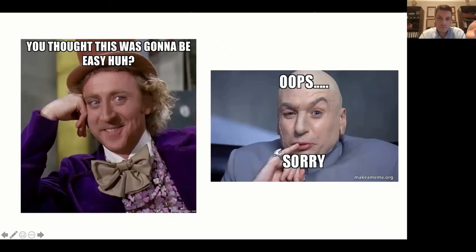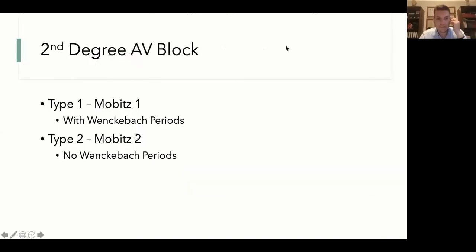I hope you didn't think it was going to be too easy. So, second degree AV block, we will separate it again based on the presence of Wenckebach's period and Wenckebach phenomena, which means the same thing, into Mobitz 1 and Mobitz 2. Okay, would someone care to address what they think the presentation of Wenckebach periods will be in the second degree AV block?